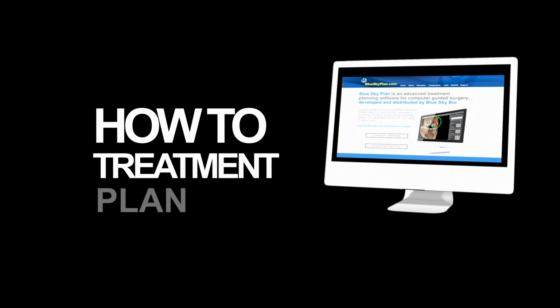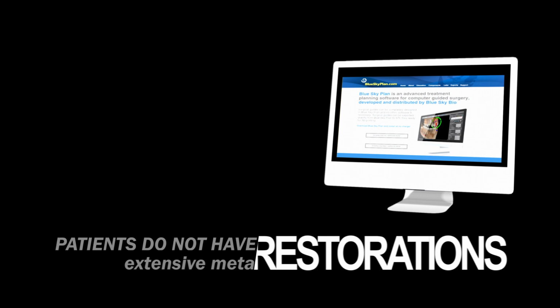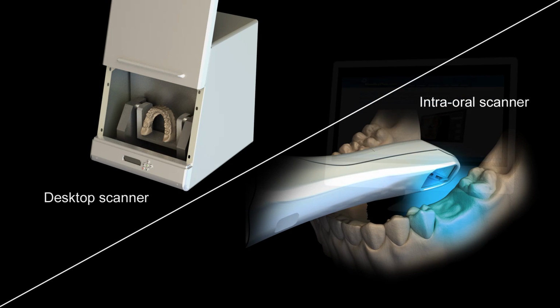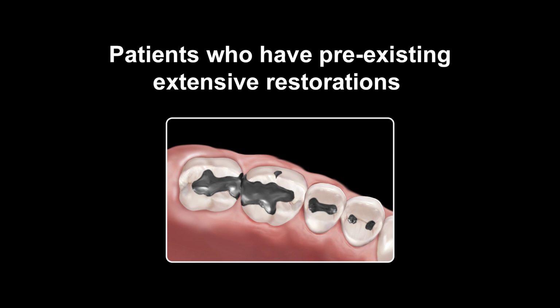This training video will teach you how to treatment plan and create a surgical guide for up to 3 implant cases for patients that do not have extensive metal restorations, using the CT scan of the patient and an optical model scan of the relevant jaw to create an STL file. For patients who have pre-existing extensive restorations, please see the animation for pre-existing extensive restoration.